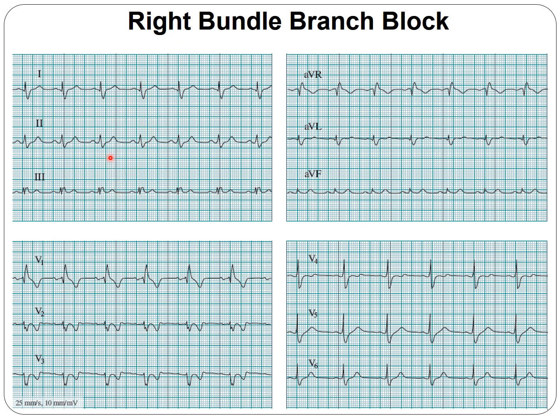When we have a wide QRS and we are suspicious about bundle branch blocks, you should look at V1 and V6. If in V1 we have a wide R wave or the ID time is elongated, that's the right side, so right bundle branch block. If we see in V6 a wide R wave, that should be the left bundle branch block. But here you can see only a wide, slurred S wave on the left side.